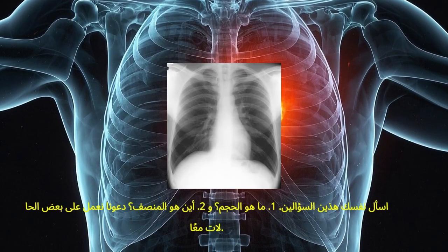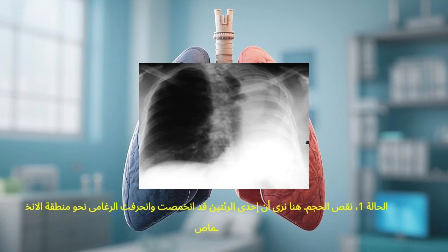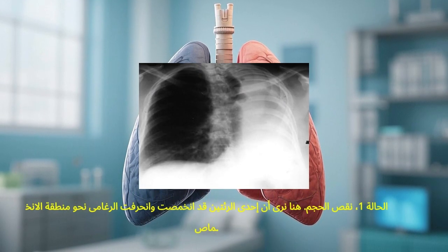Ask yourself these two questions. 1. What is the volume? And 2. Where is the mediastinum? Let's work through some cases together.